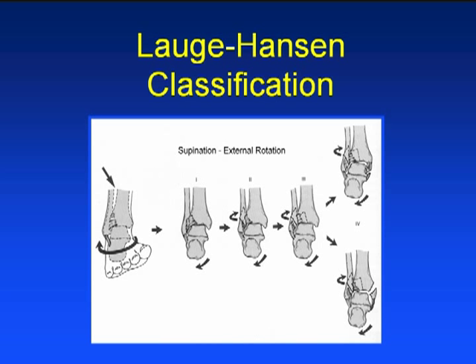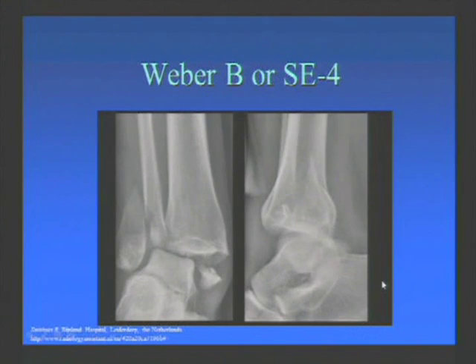The second thing that happens is that you'll stretch this ligament and then you will break the bone, and then the third stage you will come around back and chip off the posterior malleolus, that's the part that's right here, and then you will either open up the medial clear space or end up with a fracture obliquely here. This oblique fracture could actually be a horizontal pull fracture as well due to traction. So this is a Weber B fracture.